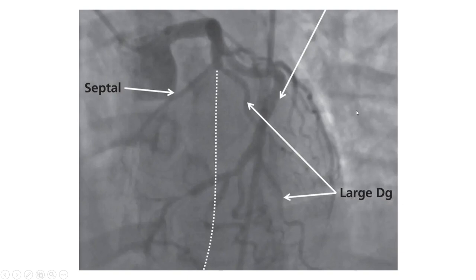To be able to identify a lesion, ideally you should look at it on orthogonal view, which means perpendicular to the lesion, not in line with the lesion, to avoid missing it.